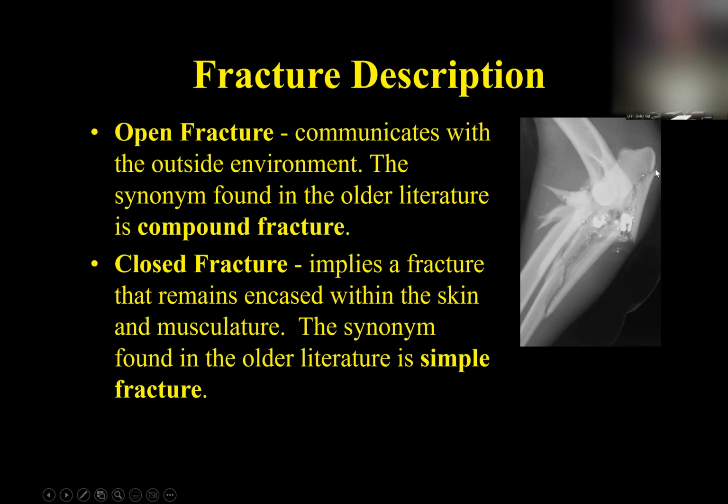There's a fracture here up near the olecranon. There's a fracture exiting right in here in the caudal cortex of the ulna. There's another fracture right in through here. It's oblique. It's coming all the way through this area, right in this area. It's exiting right here in the distal aspect of the ulna. There's another fracture involving the proximal aspect of the radius. There may be even a fracture in the humeral condyles. I'm going to have to take other views to see.